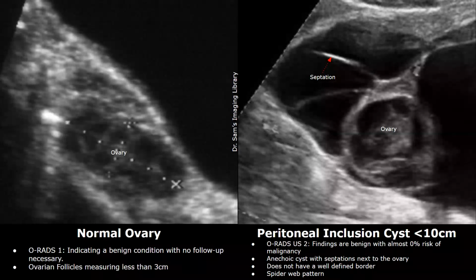Peritoneal inclusion cysts that measure less than 10 centimeters also fall under O-RADS US 2. This cyst is anechoic with septations. These internal walls are the septations. This cyst is also found next to the ovary. It does not have a well-defined border. Due to these septations and its position being next to the ovary, it gives a spiderweb pattern.